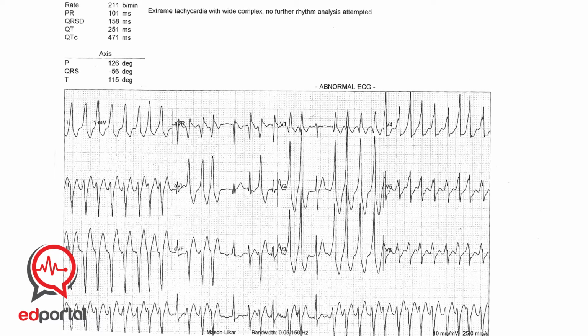So the key features of this ECG are an irregular broad complex tachycardia, and his morphologies are changing constantly, and his rate is approaching 250 to 300. So the top differential diagnosis for this ECG would be AF with WPW syndrome, right bundle branch block with AF, and polymorphic VT. Let's see how we could exclude the last two differentials.